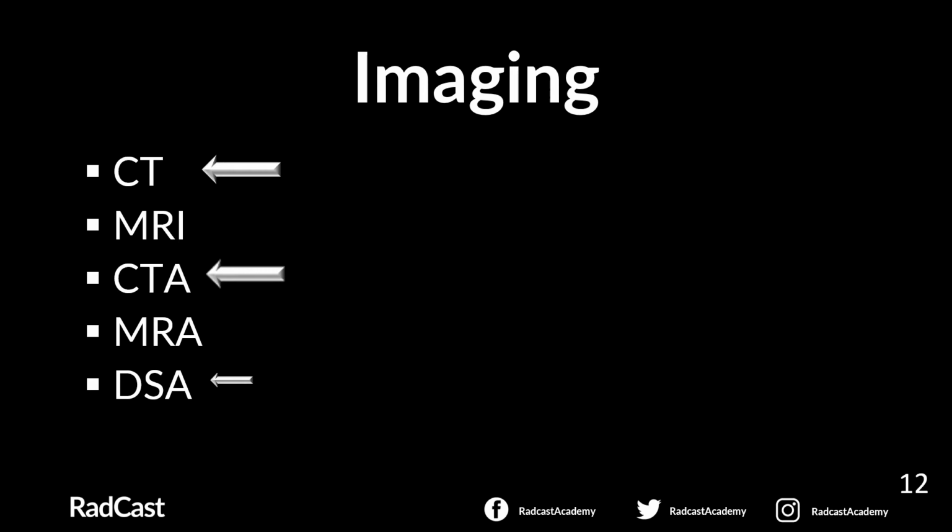It is important to remember that acute blood appears white on CT, but with time, blood becomes less white and becomes isodense. So, with time, CT is not sensitive.